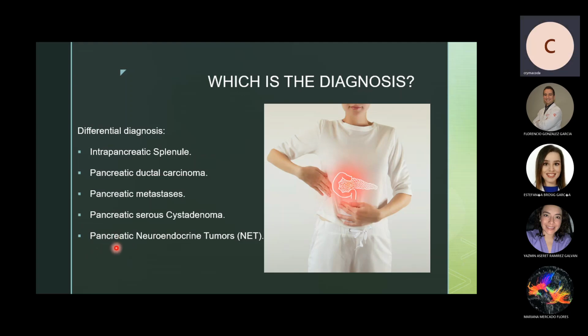And the pancreatic neuroendocrine tumors, or NETs, are well circumscribed lesions with non-infiltrating margins that are usually, but not always, hypervascular and most conspicuous on arterial phase. The lesion usually enhances to a lesser degree on venous phase, making a smaller lesion difficult to detect. Findings comparable with our case.